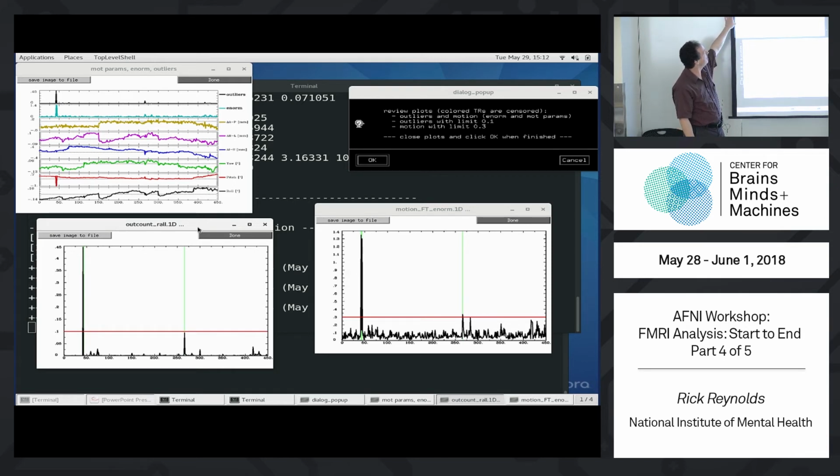And here is a combined plot that has the motion parameters and these two time series all together. For this subject, because the subject was irritatingly good and didn't move much, there's basically nothing here except this one spike that we had to fake ourselves, right? So there's not too much to see here. But normally with subjects that are moving more, you'll see these time series.